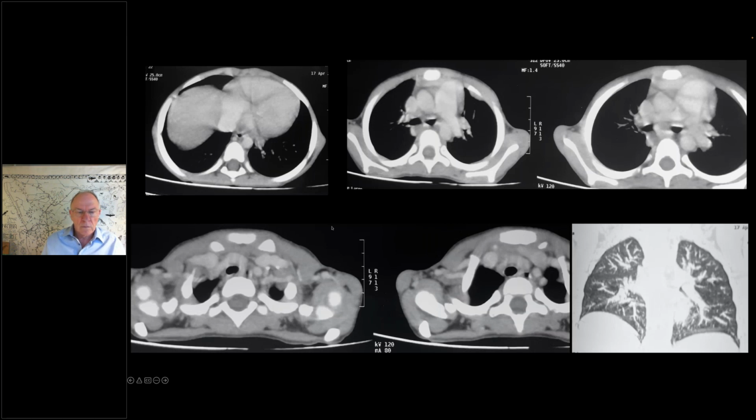The CT images were given to review for enlarged lymph nodes, but I cannot appreciate any lymph nodes on these images. For the liver, we don't have the complete image to assess for hepatomegaly, but there are no paraspinal lesions and no mediastinal abnormalities.